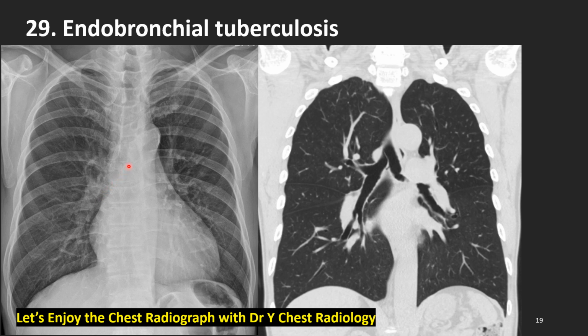But how about the left main bronchus? It isn't looking so well. Deformed or narrowed? Let's find out. Let's confirm with the coronal lung window setting. There is a finding of narrowing deformity of the left main bronchus here. This is the sequelae of endobronchial tuberculosis, deformed and narrowed.